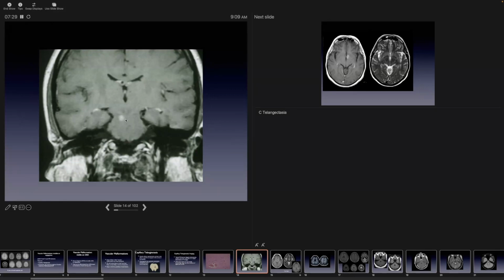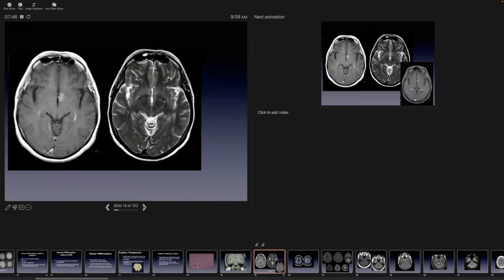The way I approach them is I look to see if on the susceptibility weighted imaging, they're dark. And if they're in a typical location, I would favor capillary telangiectasia. But as I say, in patients with a possibility of metastatic disease, it's difficult to entirely differentiate them.